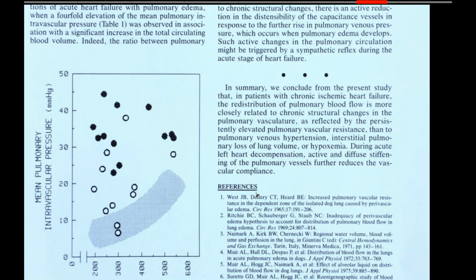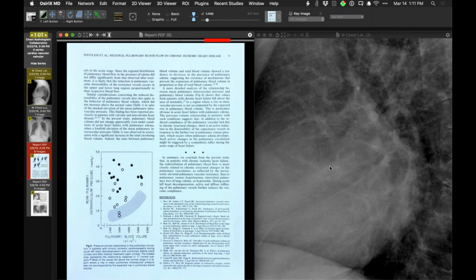Is that the article you were referring to, David? Absolutely. Yeah. Very nice case, Howard. So what was the cause of the heart failure in your case? The left atrium is big. I think this was mitral valve disease.